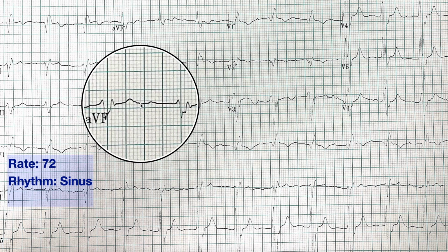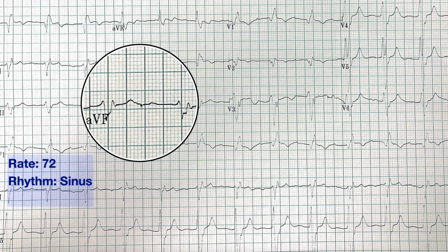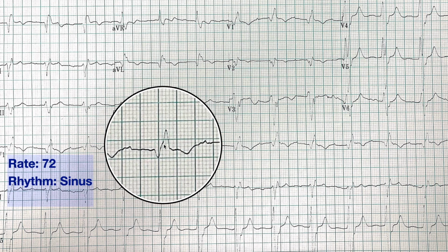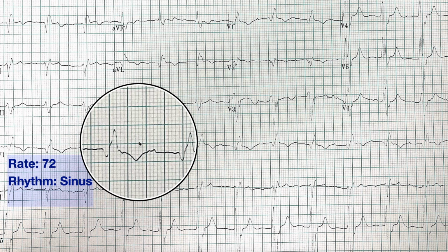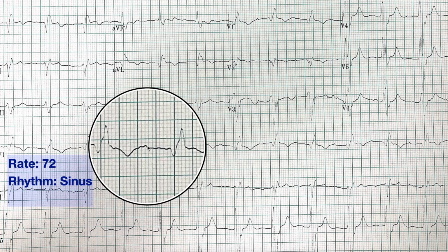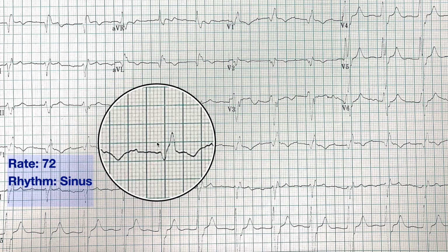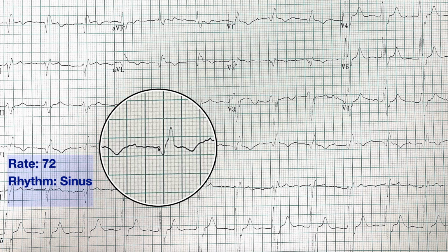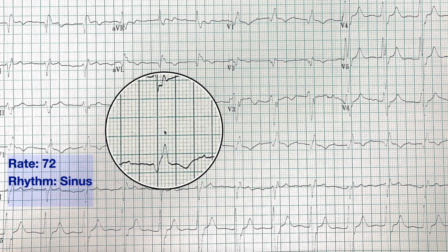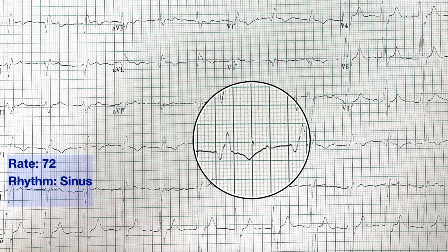It's kind of hard to sort out whether that's like a U wave or is that part of the T wave. But I think if you track that out, that kind of tracks with these little bumps as well, which maybe it's part of the T wave, but it's a little funky if it is. But more importantly, the PR interval, which we'll get to in just a second, the space from the start of that P wave to the start of that R wave, or in this case the Q wave, that is consistent if we lose that little bump all the way through. So that doesn't change, even though the heart rate may vary ever so slightly.